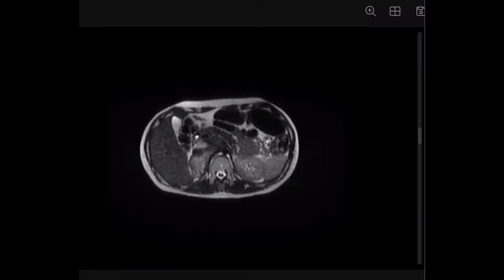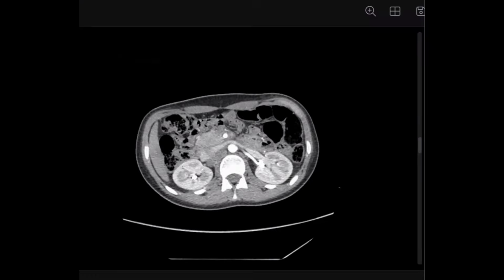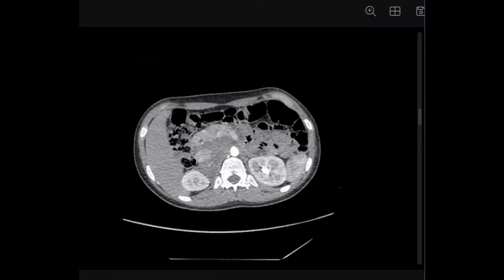Okay, what's your other differential diagnosis? What are the retroperitoneal masses? This mass is not cystic, it's solid. The differential diagnosis for retroperitoneal masses includes retroperitoneal sarcomas, but it's not a destructing lesion. But as it has blurred fat planes, it can be a low-grade sarcoma. Yes, I would keep retroperitoneal sarcoma as one of the best differential diagnoses in this case.